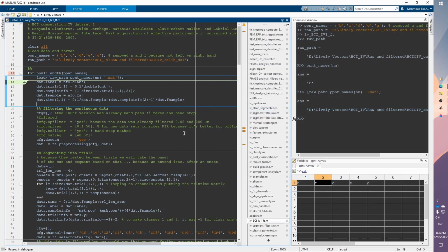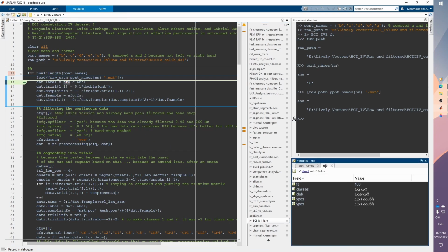We can look again at the code. In the code we have stopped at this line 14, and we want to continue. If we press Ctrl D and open this info, we see that it's a struct, and I have to say this data type will come up in a lot of videos because it's very nice to have, and I think it's a bit similar to the dictionary data type in Python.